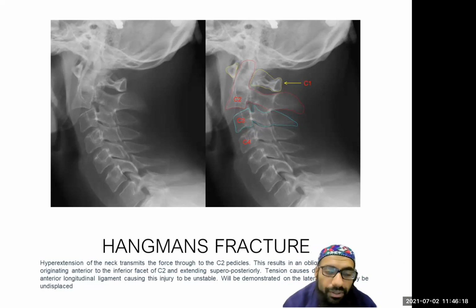Now, if you were to follow exactly what you're saying, C1, C2, C3, C4, C5, C6, C7, so this is an adequate X-ray. And if you were to follow the posterior line, and of course the anterior line, you can immediately see what's going on over there. So these are all those typical types of C-spine fractures that we see.